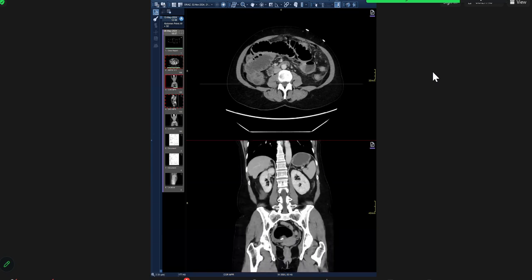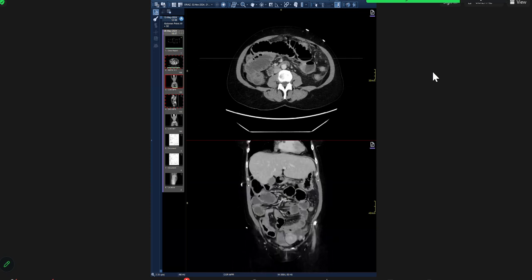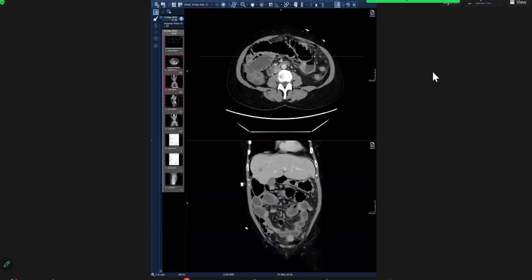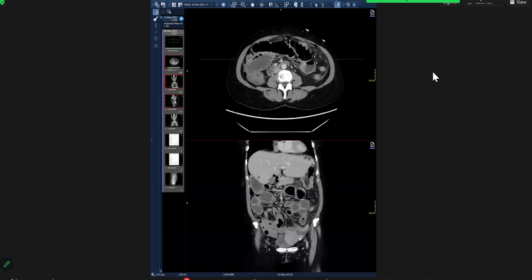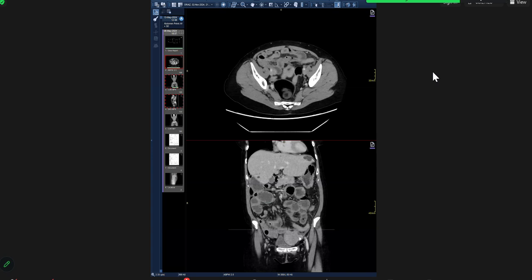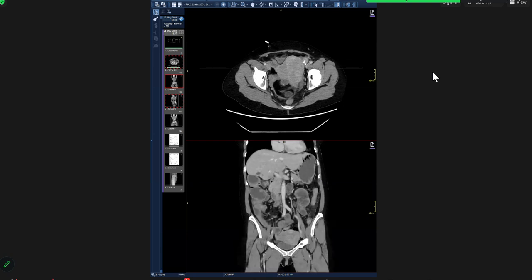Can I see the coronal images? Yeah. I can see the radio dense. Ma'am, can you scroll so that I can? On the coronal, I could see a radio density within the middle bowel loops, ma'am. This one. Yes, this one.